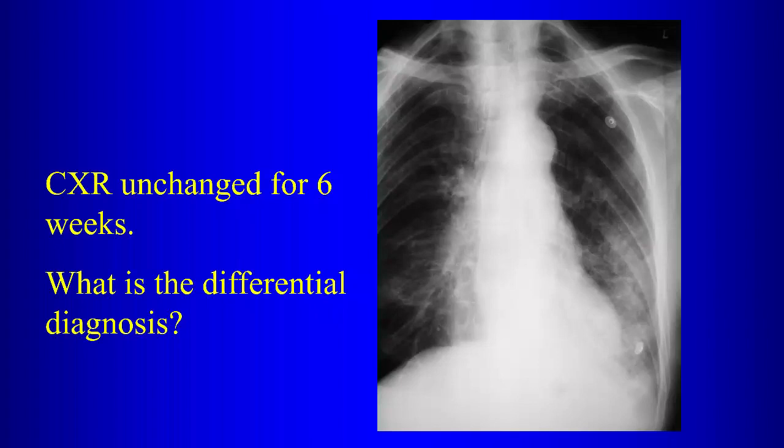So a mucin-producing tumor, like a well-differentiated adenocarcinoma, yes. Is there another way this could be cancer? It's obstructing. All right, so post-obstructive, right. So post-obstructive pneumonia, that's why whenever we read a chest radiograph from the ER and we read it as pneumonia, we always include the line that says follow-up radiographs to resolution.